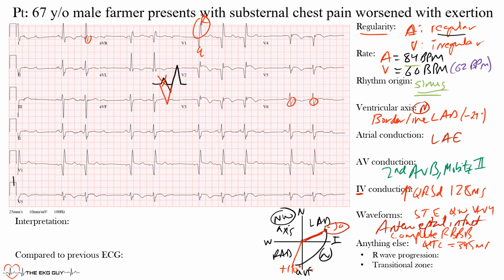Next, why may this QTc interval recorded by the machine be a problem? Well, notice we have dropped QRS complexes, and it usually takes into account the Bazett formula, which takes into account the R to R interval. If you have these changing R to R intervals, it's hard to trust the EKG machine, and that's probably why it's so low. So again, you have to be aware of this so as not to rely heavily on the machine.